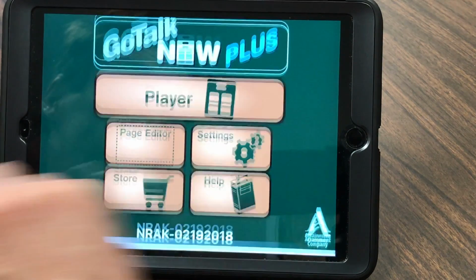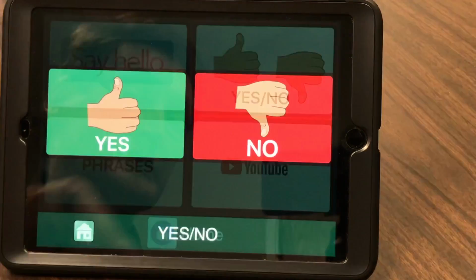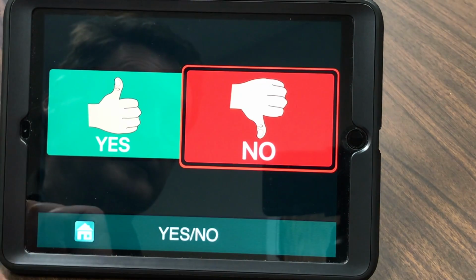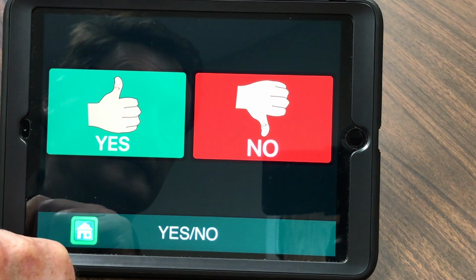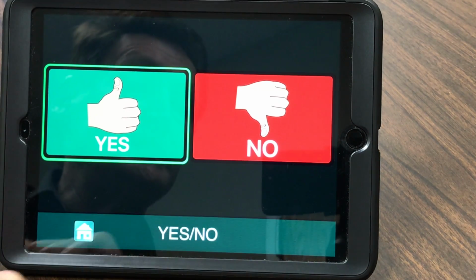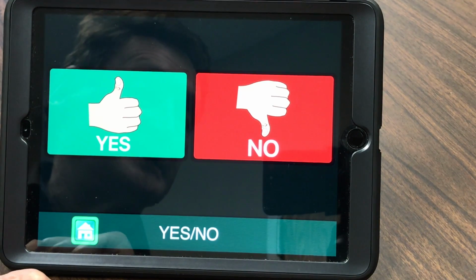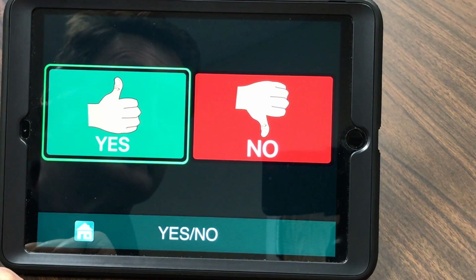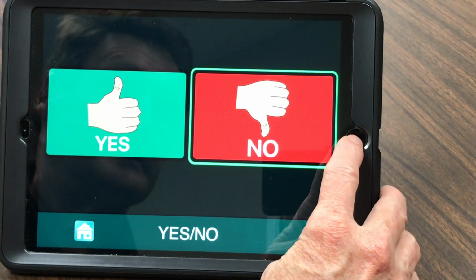So what I'm going to do now is press play, and we've got these features working. So I'm going to go into here. Yes. No. Home. Yes. So Jack would hear the initial no, home, and then be able to select for a number of seconds after. Yes. No. Okay, so we can go Home.